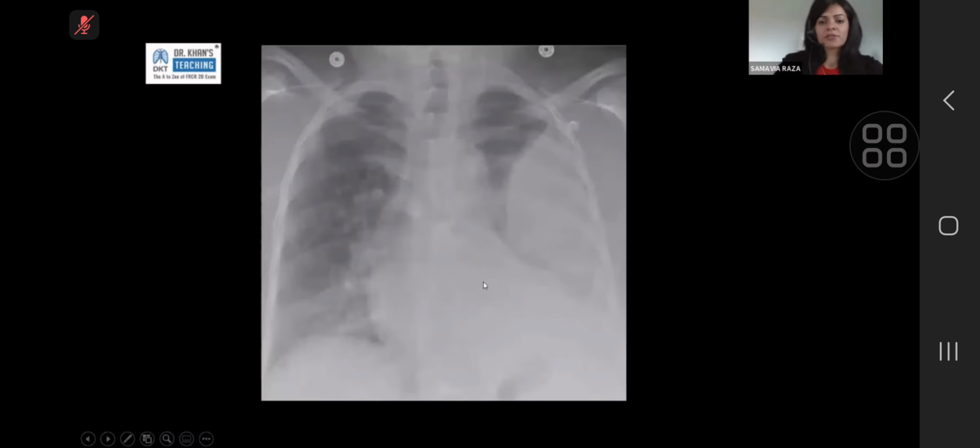This again shows a significant sized pleural collection on the left side, but what I would want you guys to consider is the shape of the collection, and then give me what you are favoring. Are you favoring infection or are you favoring malignancy? Okay, 30 seconds starting now.